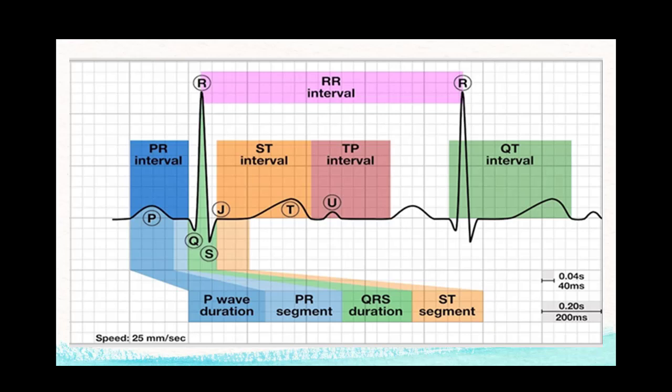And so we are looking at it left to right, so we're measuring it in time, okay? The height is the electrical amplitude. So bold grid line to bold grid line is 5 little boxes, and that's 0.20. Each individual little box is 0.04.